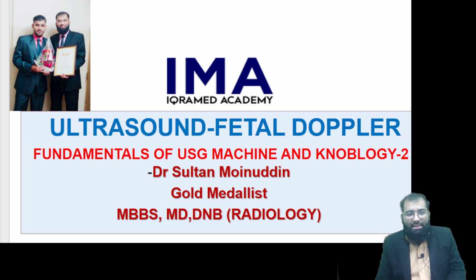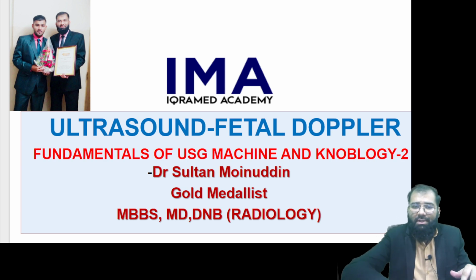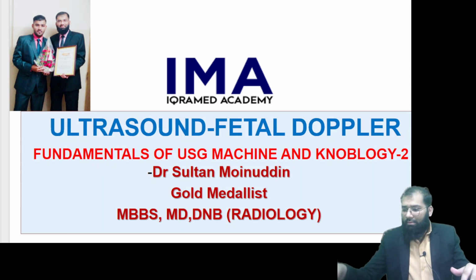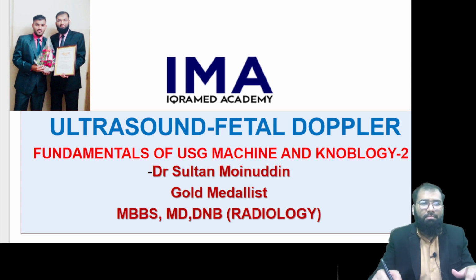Now, in my session 1, I started from very basics. That is, there is a very important knob to start the machine. And then I also discussed that the second important thing, once you place the patient on your ultrasound table, is you have to take the right preset and the right probe. Okay, so if I want to summarize my entire session from last time, it can be summarized as selecting the right probe.